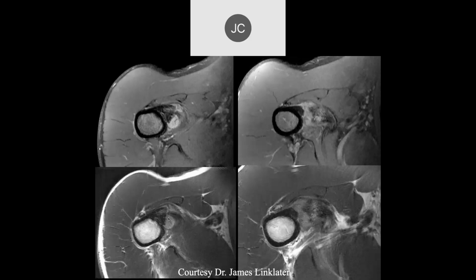So we're down low, and we were talking about some of these muscles before. That's probably the biceps tendon here. We know if it's a pectoralis, it's going to go over the biceps. What were the two tendons that inserted medial to the biceps? Was it the teres major and the latissimus dorsi? Yeah.